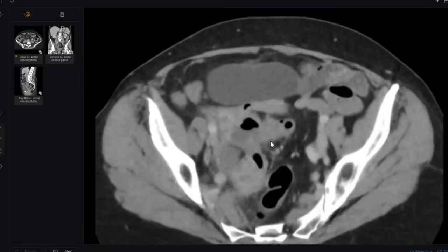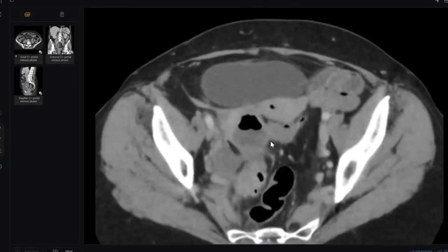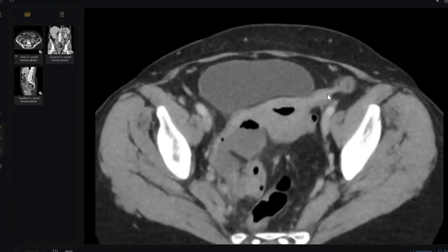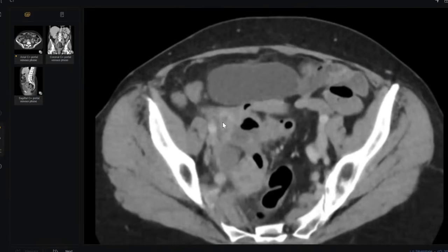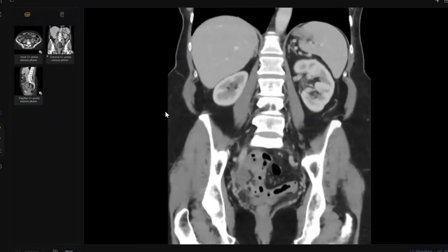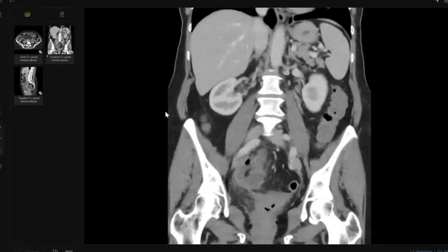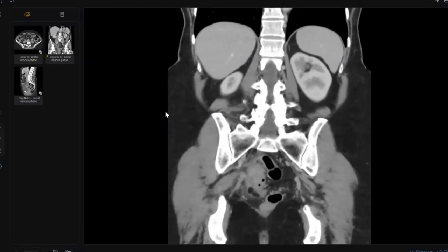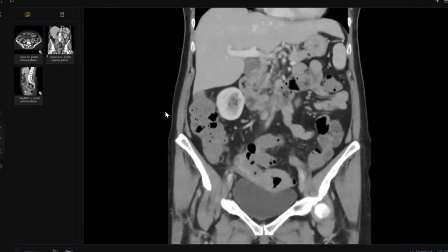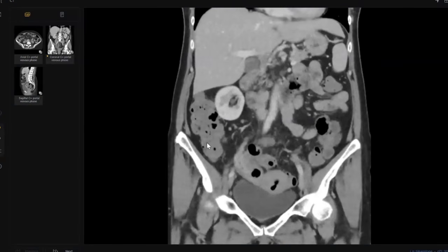No, one second. The abscess is very high from the vagina. It is, see, at the fundus. What is the name of this structure, of this tube? Uterine tube. The fallopian tube. Yes. So it is a fistula between this abscess or perforated diverticulitis with the right fallopian tube. Okay, look, this is the right fallopian tube.